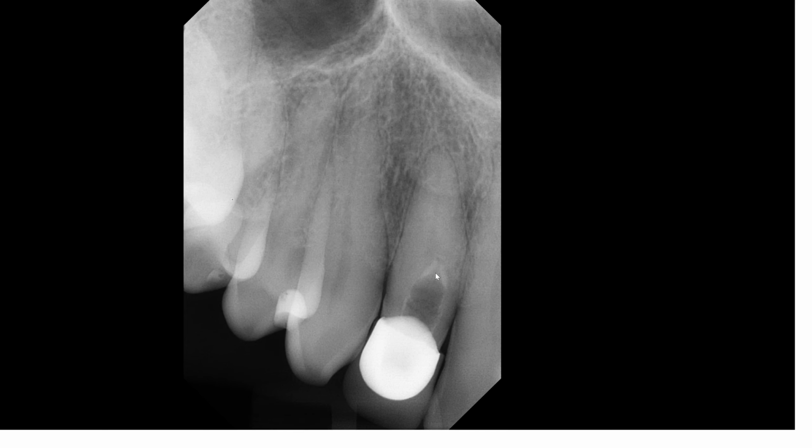Pretty much I'm going to say this is a dens in dente. Here I believe is the pulpal canal, and it's slightly off-centered from this, due to the location or angulation of this. So I don't think that this is a continuation with the canal. Therefore, I'm going to say dens in dente as my final definitive diagnosis. However, if you considered internal resorption, I think that's still a decent differential diagnosis for you to consider.